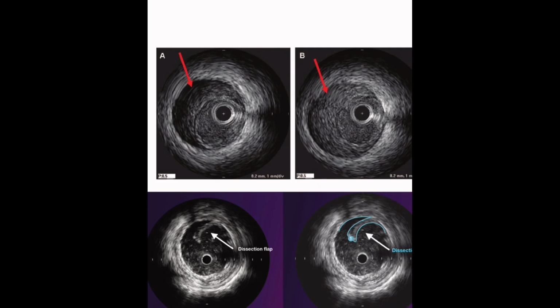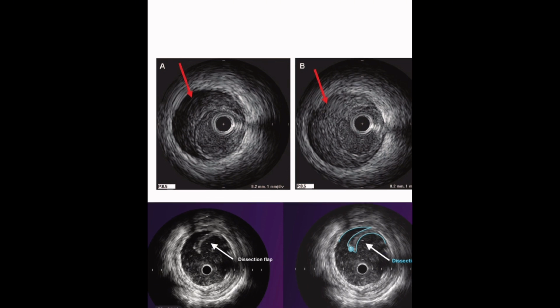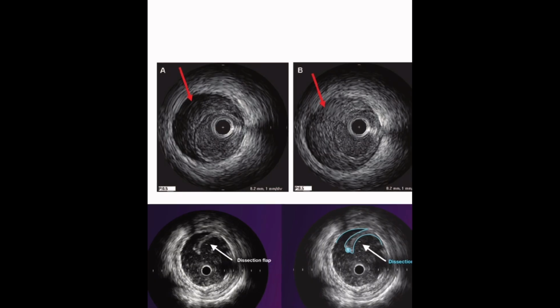So if I did an IVUS and I saw this, and it stayed that way, I'd be like, well, okay, maybe that's a stable hematoma because there is no connection for it to receive blood. There's, in this case, minimal movement, but if this was all black, no movement. Whereas here, it is still receiving blood flow and has the ability to develop. Not something you see very often, but when there is a case example, being able to showcase that is a really cool thing to see.